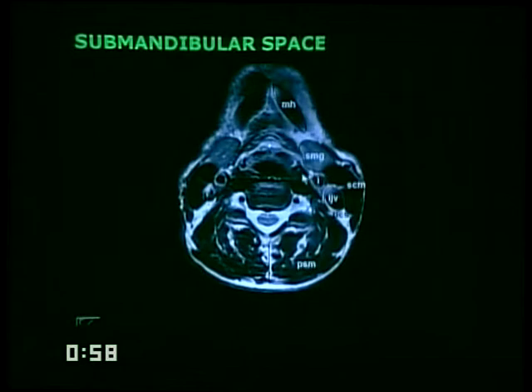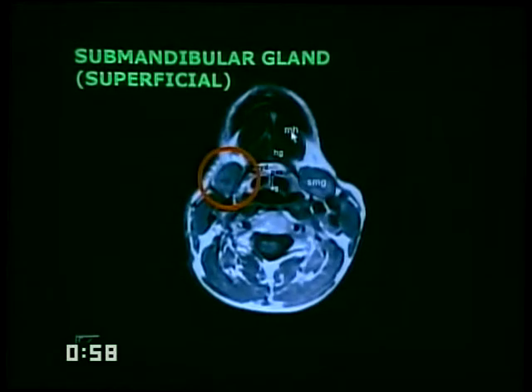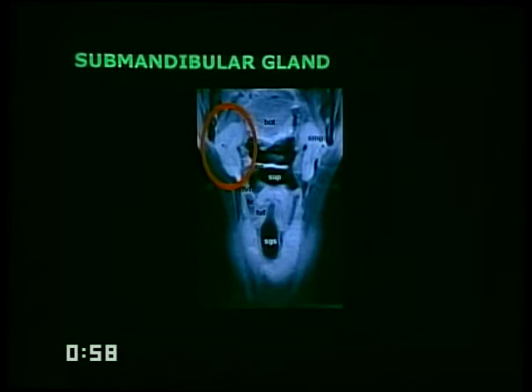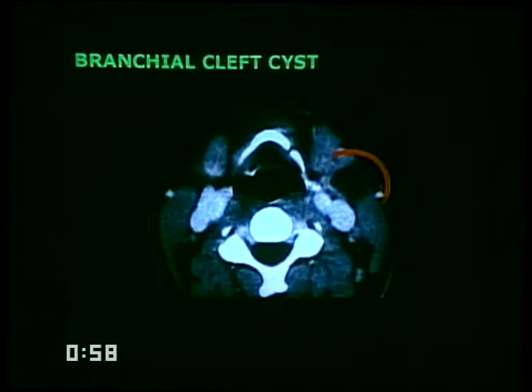Again, there's your submandibular gland. You can identify the mylohyoid muscle at this level. Variable anatomy, variable shape. They can extend inferiorly up to and even inferior to the axial plane of the hyoid bone. They can be oriented transversely or longitudinally, and they can have heterogeneous textures.